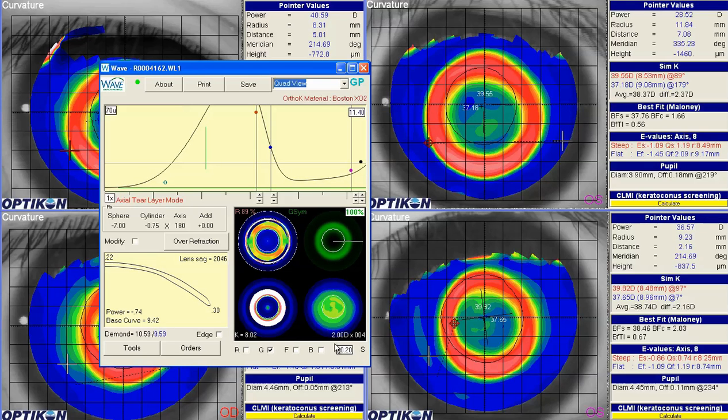Okay, so I've added in my shape factor, and our demand is way off now. So I'm going to, in 100% mode, just click down until we are where we were. Okay, we're kind of close.